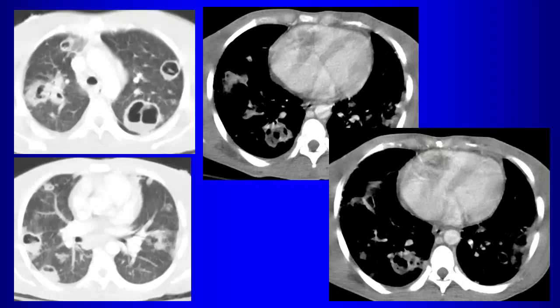So you have bilateral cavitary lesions, air fluid levels. Right, we have these bilateral cavitary lesions with air fluid levels. So what do you suspect that this represents? Septic emboli. So you would suspect septic emboli, right? Especially given that peripheral distribution of some of these. Now take it to the next level. Is there another finding here that you'd want to discuss too?